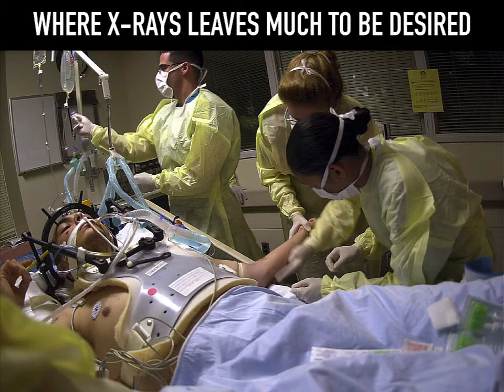In many cases, X-rays leave much to be desired, particularly in the unstable patient who can't be mobilized, or is perhaps hemodynamically unstable. Again, in a supine patient, we're often left looking for either a large pneumothorax or that dreaded deep sulcus sign.